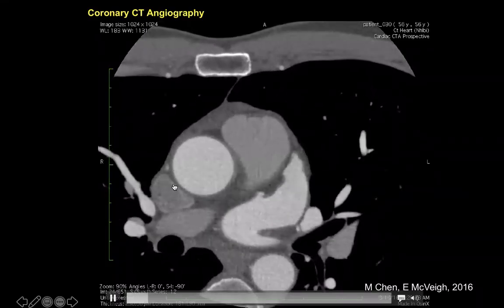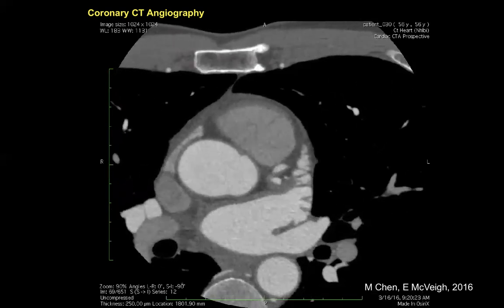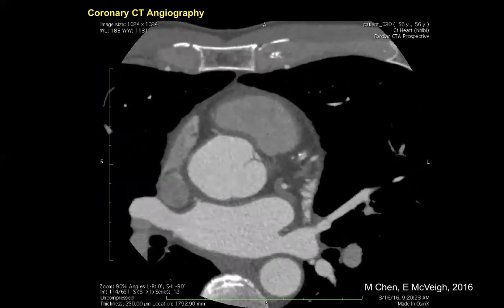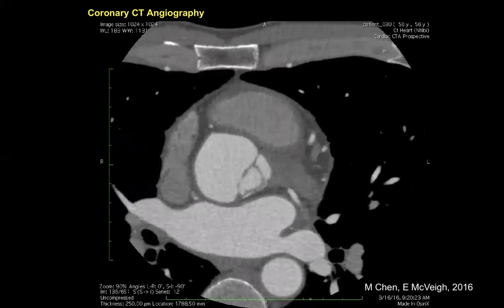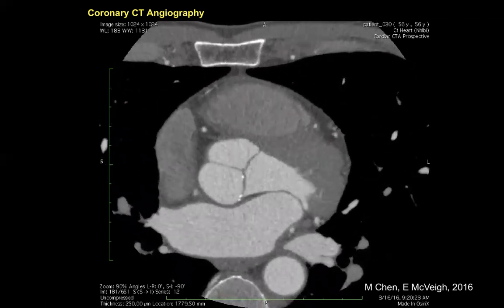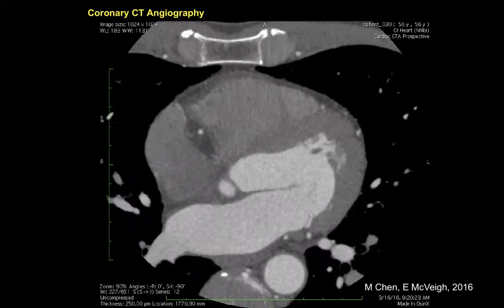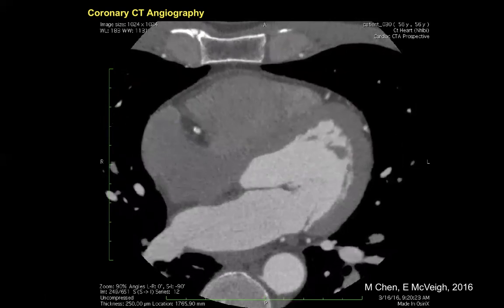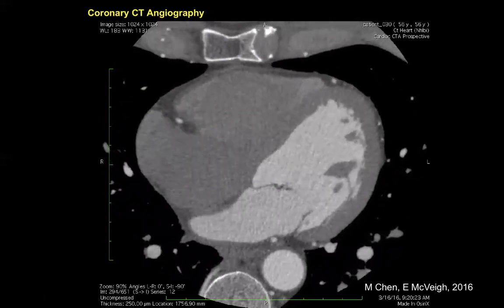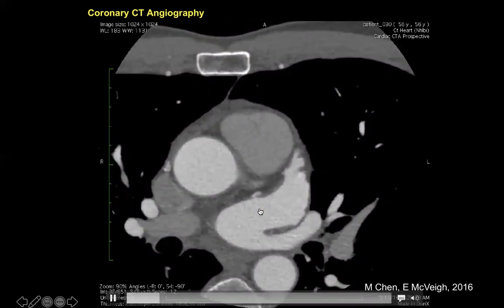This is the results from a high resolution scanner. And at the time that we took this data, this was an experimental scanner that came out of Toshiba. What they did was they increased the number of detector elements on the X-ray detector by a factor of 2 in both directions, both in the Z direction and in the theta direction. And so the detector element itself is 1/4 the area of the standard 1 by 1 millimeter detector you get in most CT scanners.